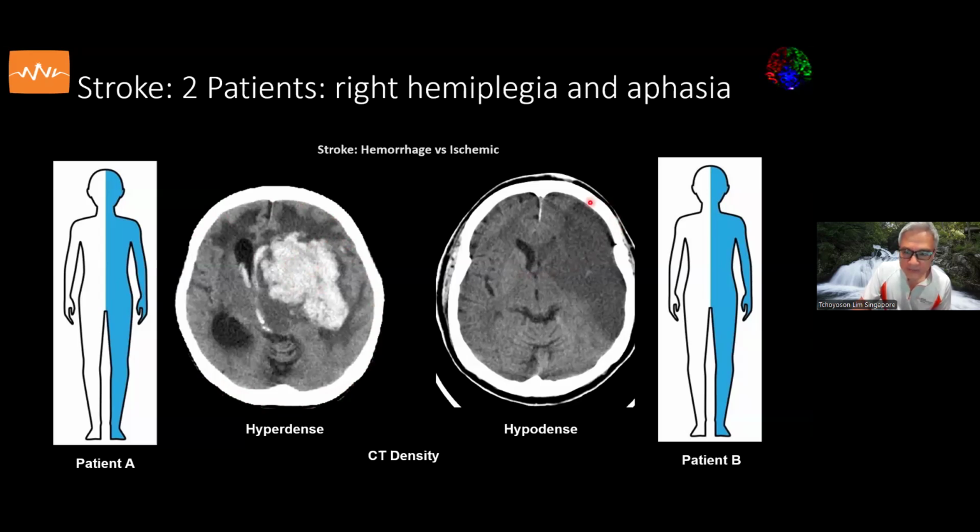On the other hand, a patient who has a well-established infarction has cerebral edema and more water per voxel of tissue. Because water stops X-rays less effectively than brain structures, it is hypodense, very similar to CSF, which is almost pure water, and cerebral edema is known to be hypodense.